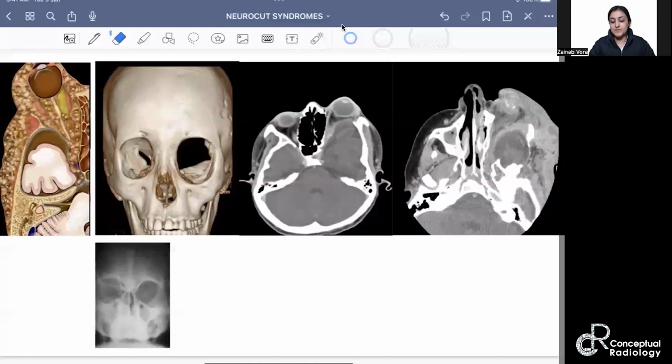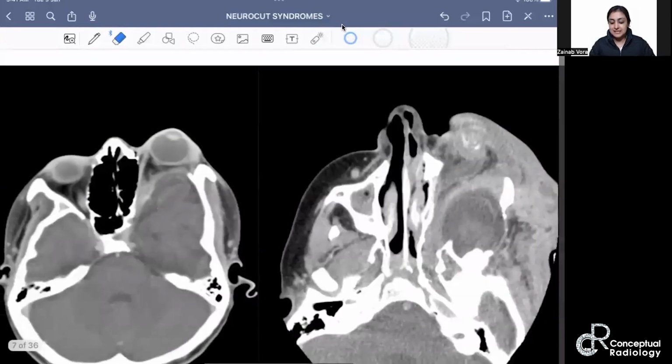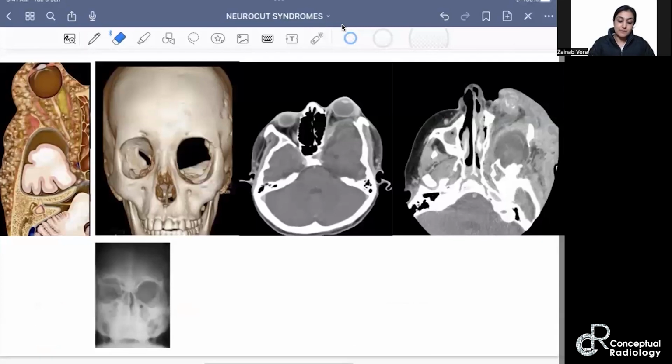So this spotter comes and look at this CT, classical CT, where I see that the arachnoid fluid here is herniating anteriorly, and you have the soft tissue mass which is growing along the temporal aspect of the face. So this is a plexiform neurofibroma. What you are seeing here in this VRT, so beautifully, compare it with the right side, you see that the greater wing of sphenoid is absent. So what you see here is the sphenoid dysplasia, a part of the major criteria.